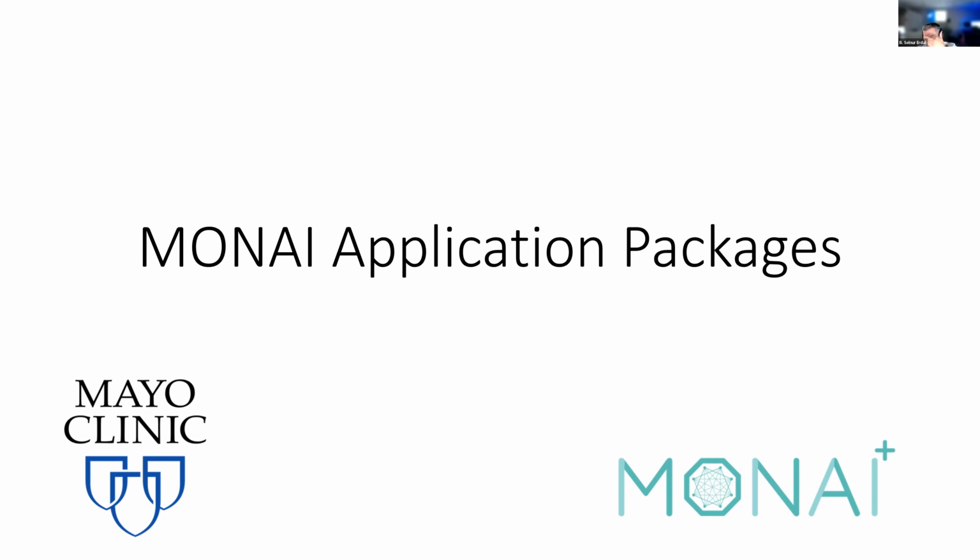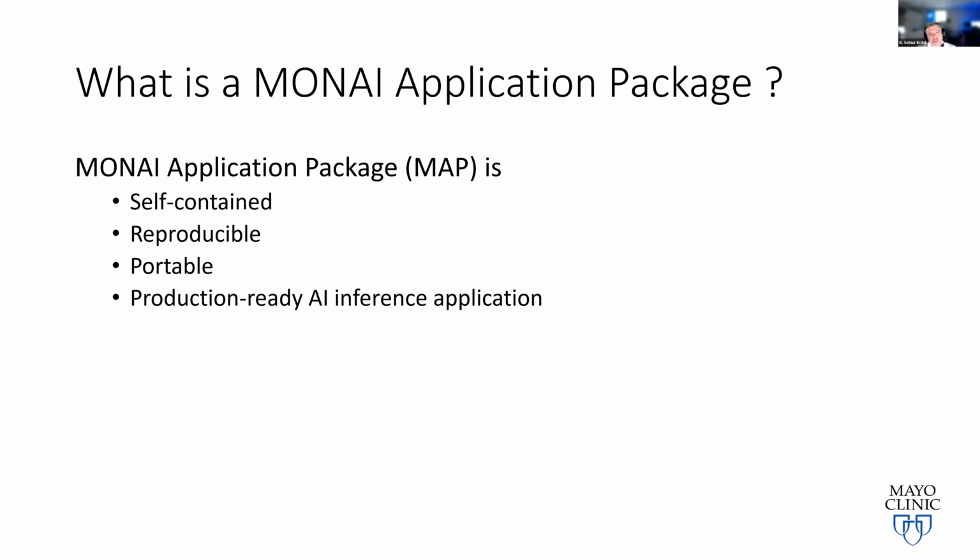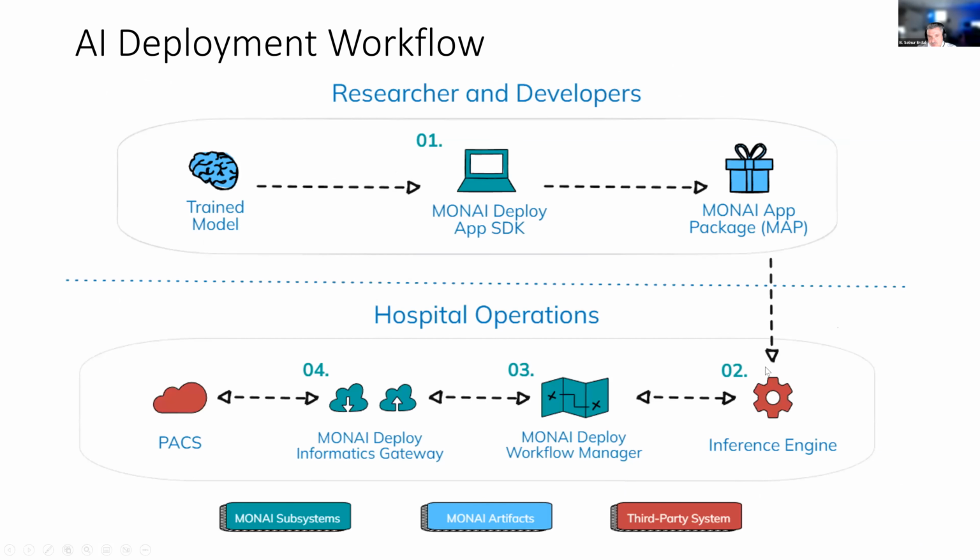Now, with this, we're going to get more into MONAI application packages here. Then at the end, I'll tie the story back into how we are doing this with the OHIF viewer and everything in place. So, MONAI, when we said MAP, we coined the term MONAI Application Package. What is that? What's going on here? How do I make your application standards compliant? Okay, now.